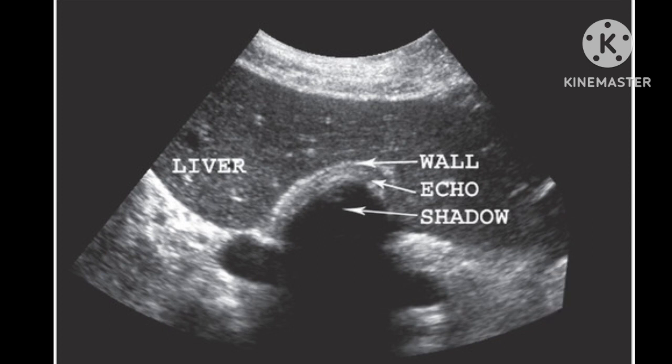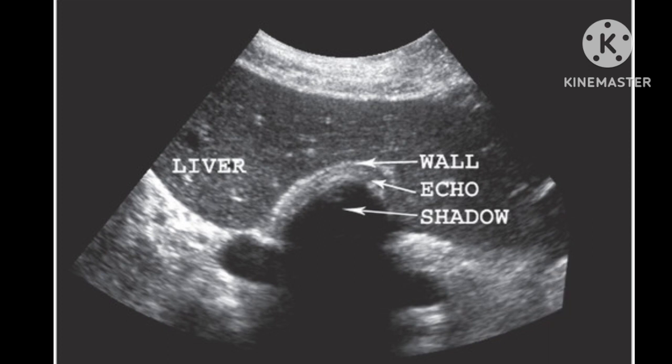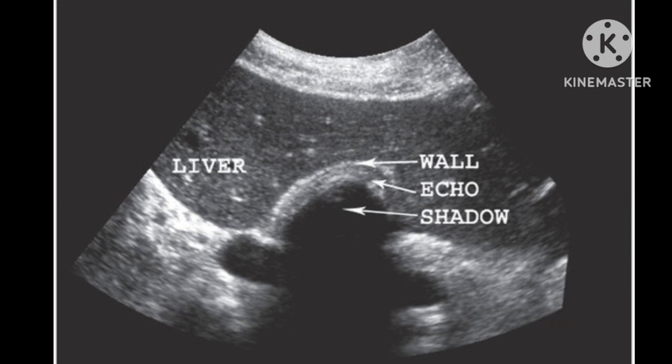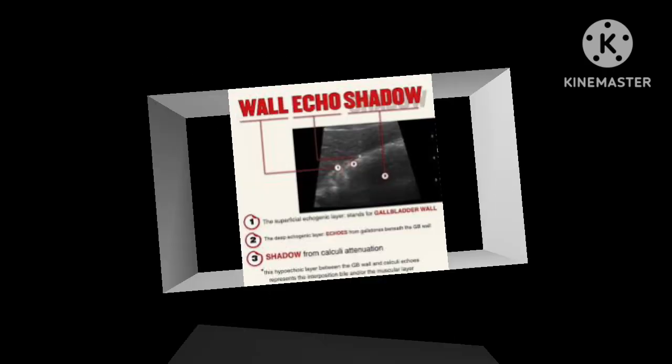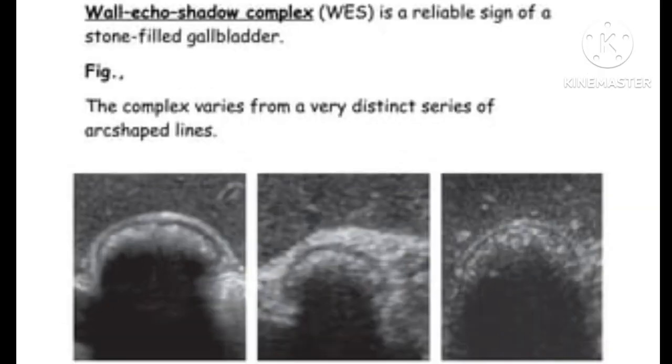Look at the slide showing WES complex, seen in case of gallbladder filled with multiple gallstones.